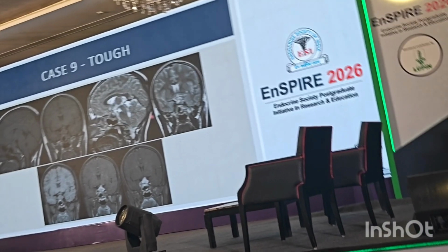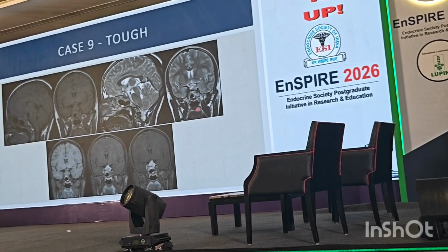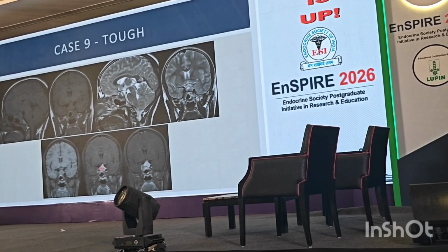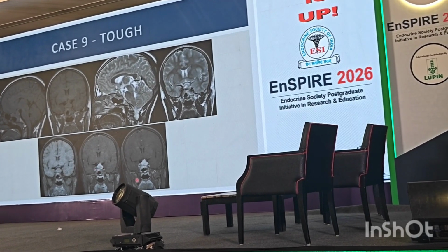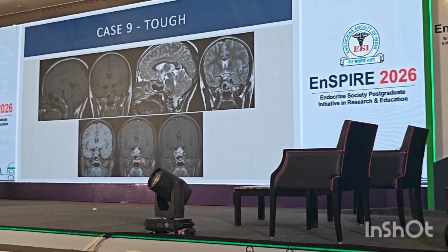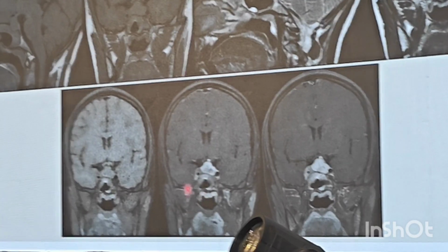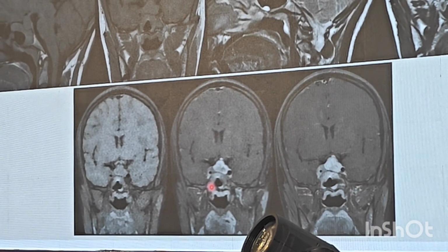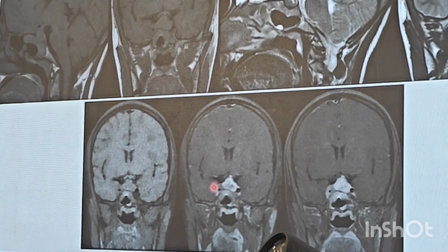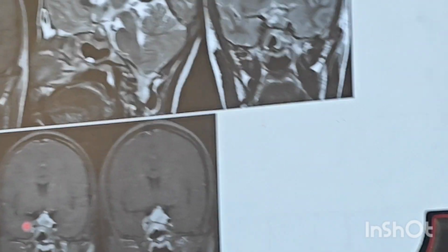So the patient has got a macroadenoma. What I want you to pay attention to is the internal carotid artery. These are dissimilar in size. So I was dead sure that on this side it is encased by the macroadenoma, so it's not changing in size. But on this side there is some other pathology, and it is fungal sinusitis which is going there and encasing, and it is narrowing. Pituitaries do not narrow your ICAs.